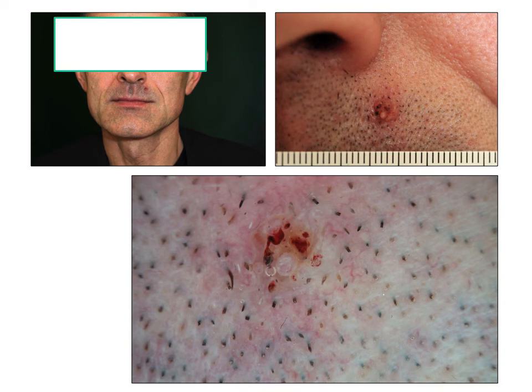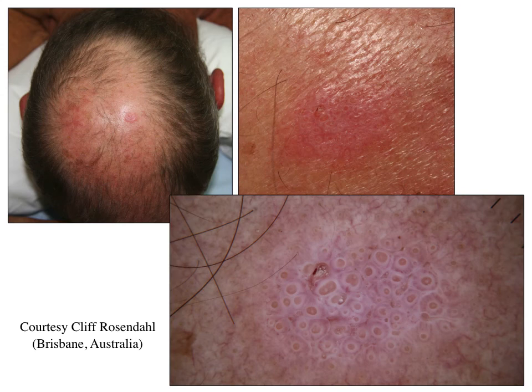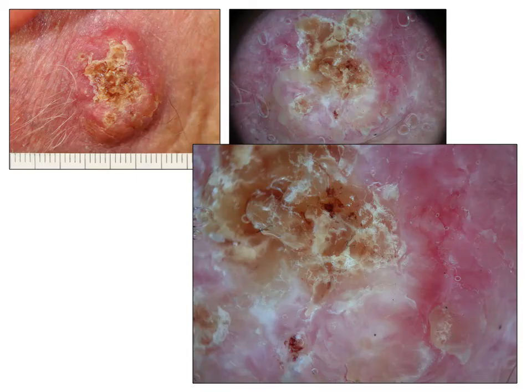In these flat lesions, it is important also to rely on the presence of these white circles that are almost the only feature in this case, and diagnosis is very helped by these white circles.